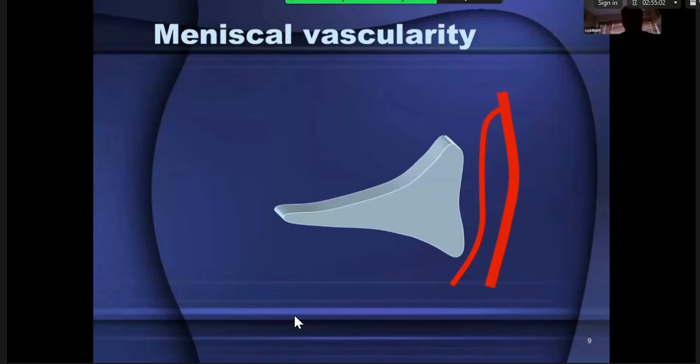The meniscus, which is fibrocartilage, has normal vascularity, particularly in young age. In patients who are less than 30 years old, this increased vascularity can be quite prominent and result in a slightly increased signal intensity compared to the normal low signal intensity which you see in MR segments of the knee. We have to be aware of that increased vascularity because that again can be called a tear.